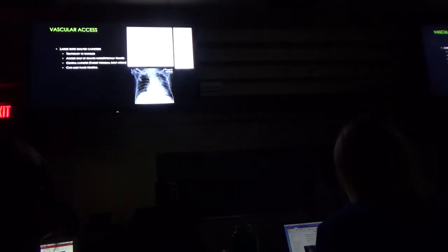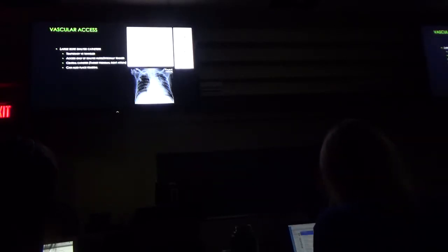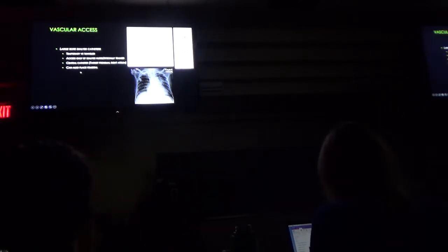And so they'll put a port in so that the phlebotomist doesn't have to be working and poking that patient 5 or 6 times before they can access blood. Or even for an IV access, you need IV fluids to go in, and so they put a port in. It's not going to be a tunnel dialysis catheter. There's a difference, but they look very similar. So again, ask the patient, can I use this port, or can I use this catheter? And they'll tell you whether or not you can use it. That's what it looks like on X-ray, the little thing that you sew to them.